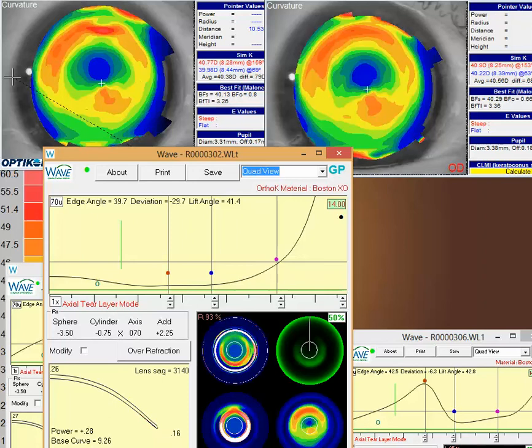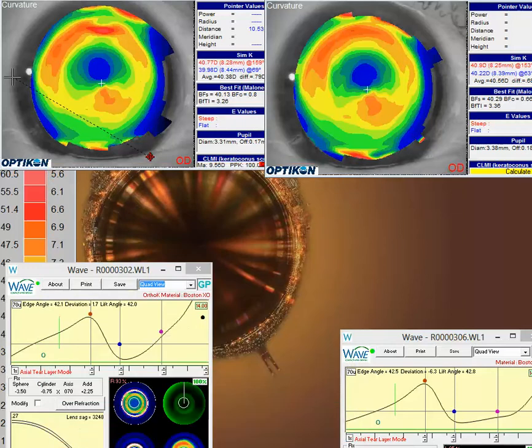One thing to keep in mind if you do go to freeform: because it looks at each meridian separately, if you're making adjustments on the lens, you can't rely on the 50% mode. You have to actually go to 25% and make any changes in each meridian all the way around. Just a thought to keep in mind when you're in freeform. As far as powers go, if we look at your lens, I'll go back to your original lens.